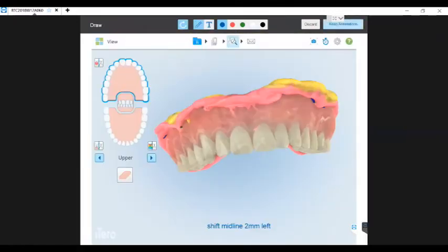Hey, Kelly, really quick, would you be able to move your mouse cursor over the camera icon to show them what you selected to take a screenshot? Let me attempt it. So I was touching on the screen itself versus using the mouse on my computer. So now I'm using the mouse and it's disappearing when I get to the screen. You might have to enable it in the settings up top if you bring down that banner again.